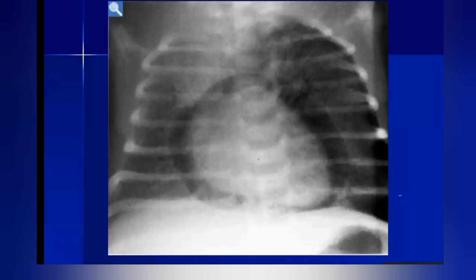So this is outlining the heart, and I'm more suspicious of a pneumopericardium. Fantastic. With the pneumomediastinum. Yes, sir. What they call the sign. Continuous diaphragm sign. Yes, continue. Although it's very rare to have pneumopericardium, it's recognized.